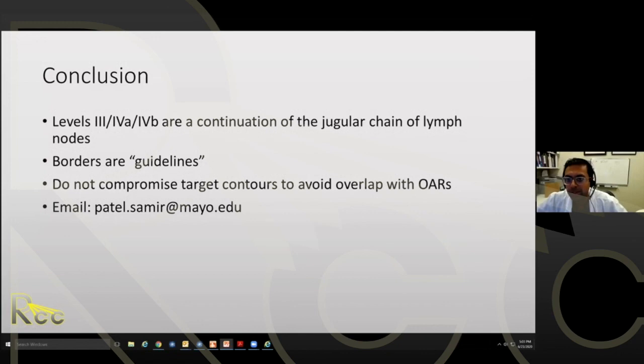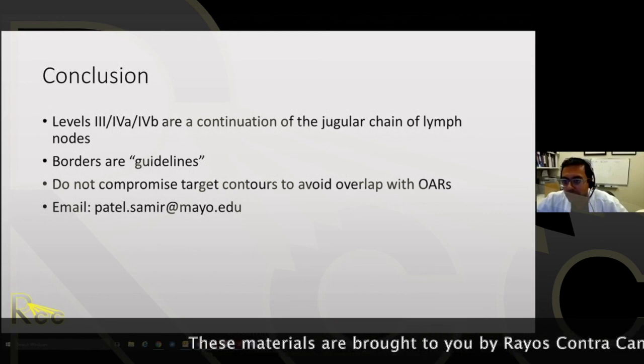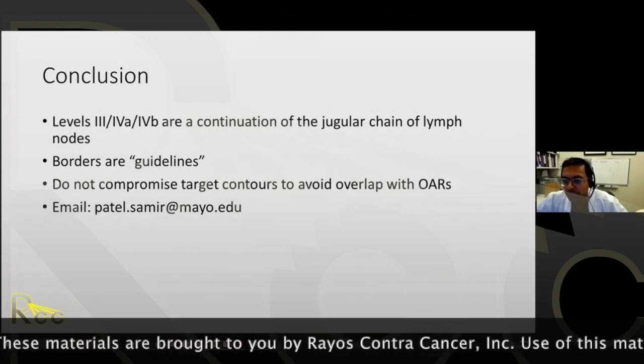The reason why I sometimes try to just include the medial half is if I'm not worried about extranodal extension at that level, or I trust my surgeon that there is no tumor spillage, then I can maybe reduce some of the risks of neck lymphedema by not treating the superficial aspects.